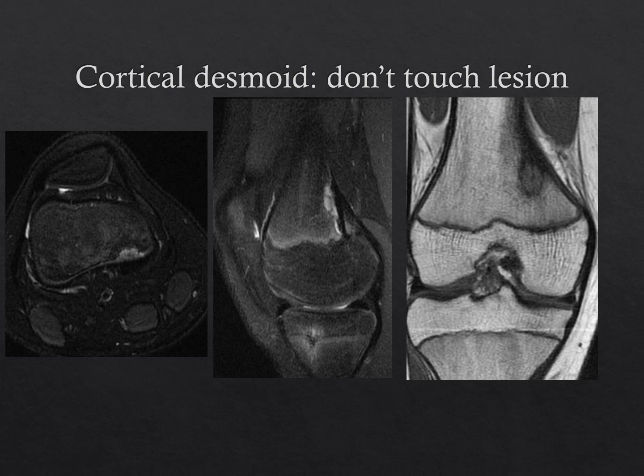Another variant seen at the knee is the equivalent of the cortical desmoid lesion seen by plain film. This has many names, including distal femoral cortical irregularity and avulsive cortical irregularity. It is at the site of attachment of the medial head of the gastrocnemius or adductor magnus tendon. It should be recognized based on its classic medial posterior location along the distal femoral metaphysis. It is subcortical and may have an ovoid shape on coronal images. Most of the time, this is an incidental finding.